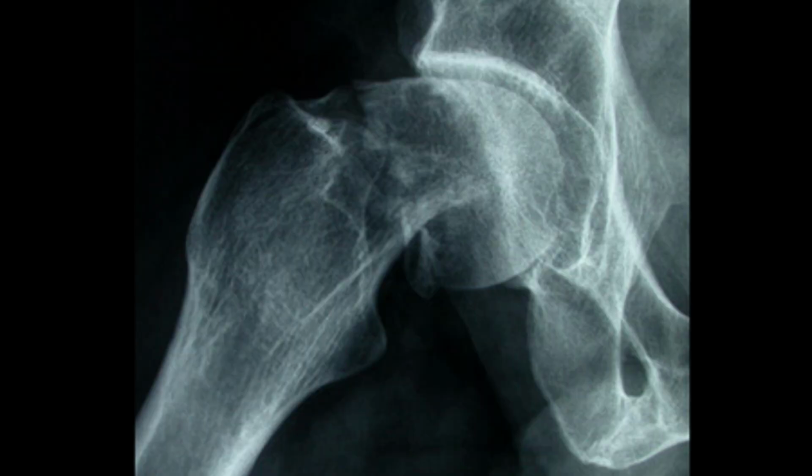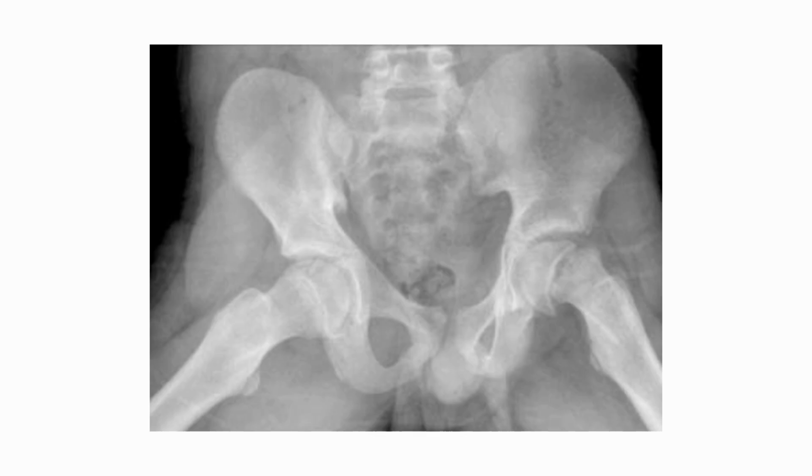This is your classical neck of femur fracture. Elderly people come in with a fall and an externally rotated, shortened lower limb, and that's your right neck of femur fracture. This is not a fracture, this is slipped upper femoral epiphysis, usually in adolescent males who are obese. They'll come sometimes with a limp and knee pain. You need to get the x-ray and you will see the slipped upper epiphysis.